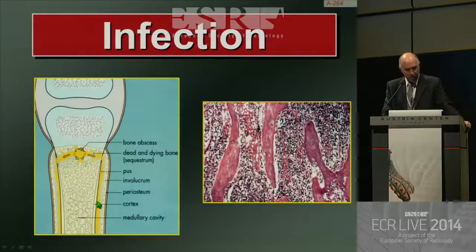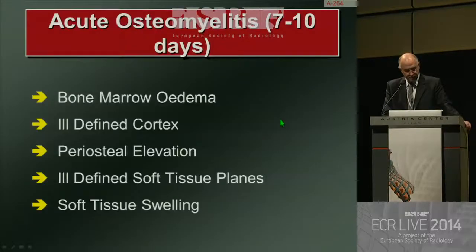And in doing so, it can strip the blood supply of a large area of the marrow bone, and it can also strip the blood supply of the cortical bone, producing bone death. So when you look at this histology slide, you can see there's bone here. There's still some cells telling you that the bone is alive, but notice the whole marrow space is completely replaced.